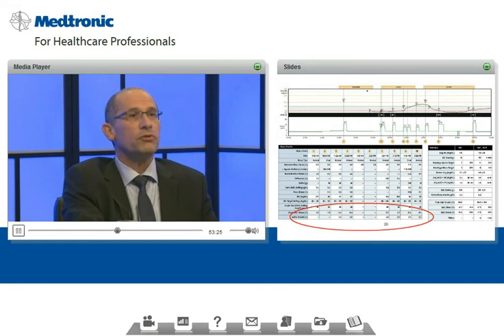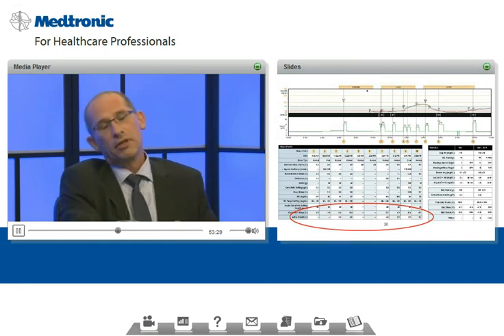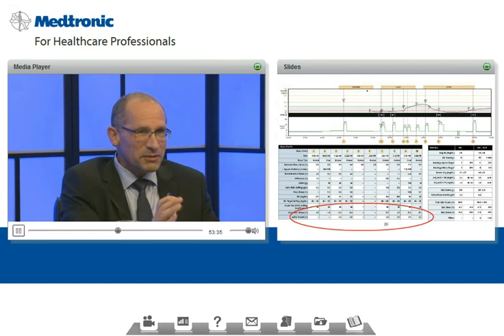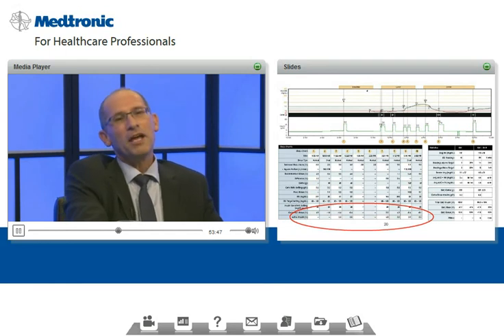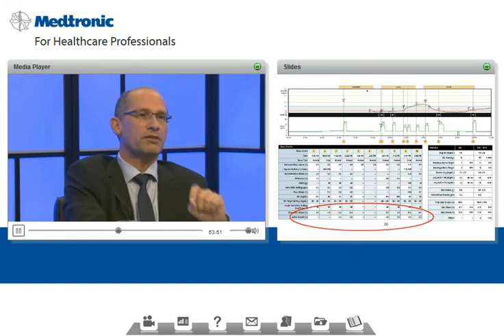So now we can go into details, specifically that specific day, to see if the issue is a bolus or the issue is a basal. And it also can give you the specific details of every bolus the patient made in a specific day. Is he using the Bolus Wizard? Is he overriding the Bolus Wizard? But it also gives you an insight on the quantitative difference between what he needs to have and what he gets from the pump.